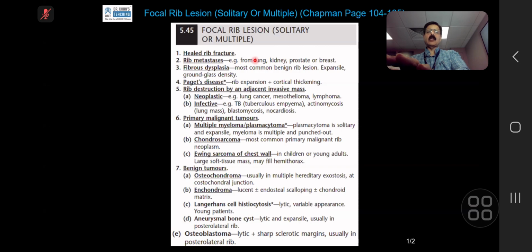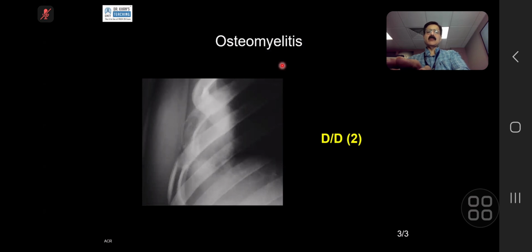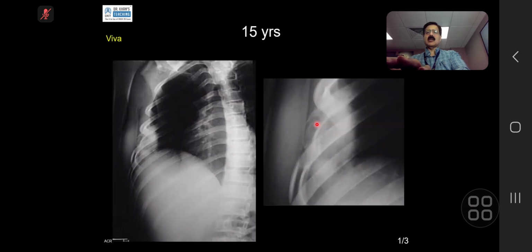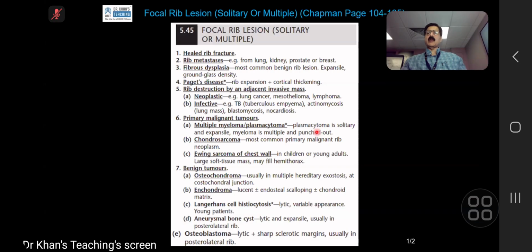So you did confine yourself to a young age group, 15, in your differential, but enchondroma, this is not at all enchondroma. Enchondroma is not an aggressive appearance. It will not cause this destruction, etc. Ewing's, by the way, in flat bones is more common. What I mean is that you apparently have this concept that it is more common in long bones and not in flat bones or the axial skeleton. No, that is not true.